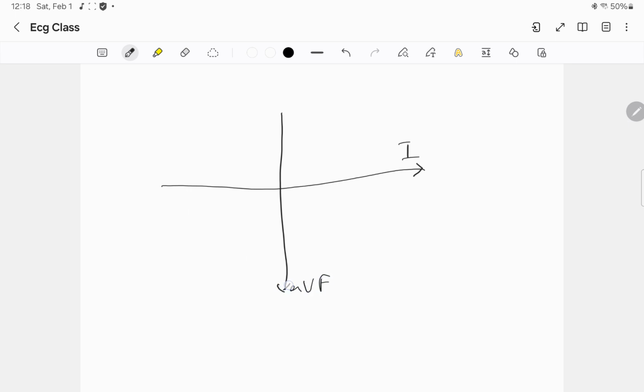Now, I'm going to preface this discussion by saying that determination of the cardiac axis can get a bit more complicated than this, but this basic interpretation of axis is sufficient for most ECGs, especially for the beginner. But you can use other leads to assist in your interrogation of the cardiac axis.